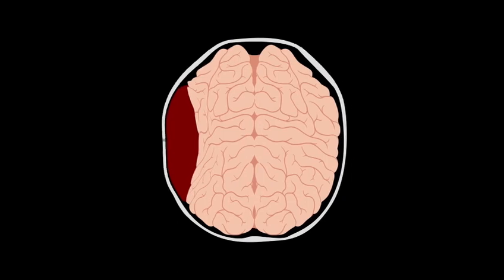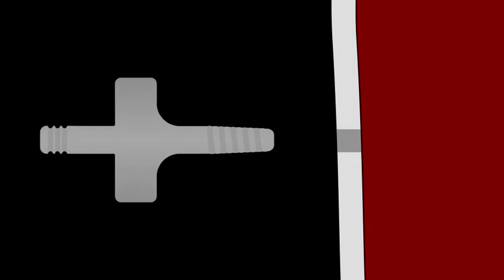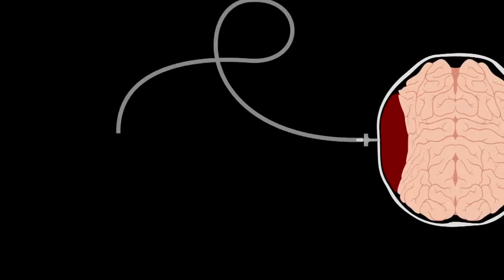The threaded end of the NASP is conic, starting at 6.5 mm, extending to 8.5 mm, so it will engage with the bone and be very tight, thus preventing loosening, disconnection, and overpenetration of the skull. The NASP is made of an engineered transparent polymer that is much less thrombogenic than metals such as titanium or stainless steel.